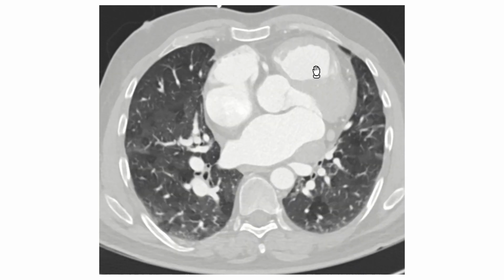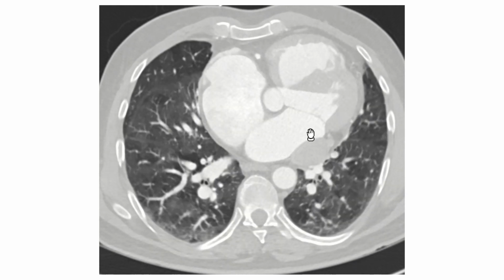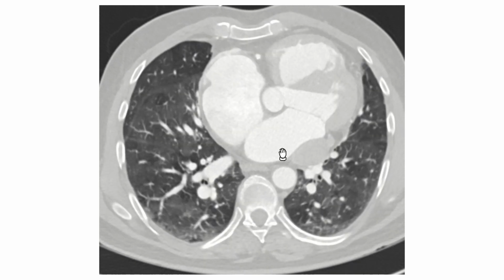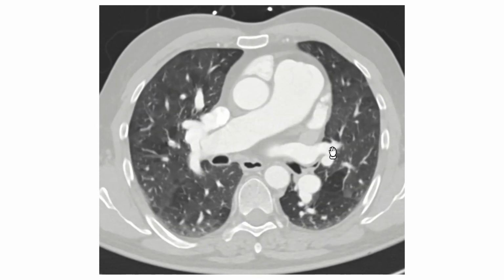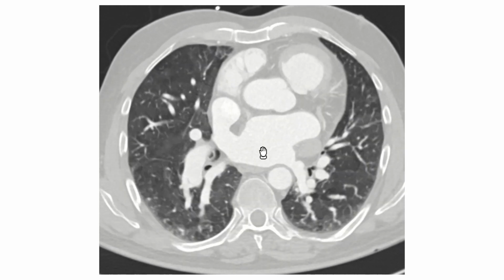The pulmonary is coming from the right ventricle, and the aorta is coming from the left ventricle. We could see the mitral going to the left ventricle, and the tricuspid, from the displacement of the septal leaflet, we could tell that this is the tricuspid valve, and the tricuspid valve always follows the right ventricle, so it is AV and VA concordant. If we want to check the pulmonary veins, we could see on the left side the left lower pulmonary vein, and then the left upper pulmonary vein, both of them going back conventionally to the left atrium.